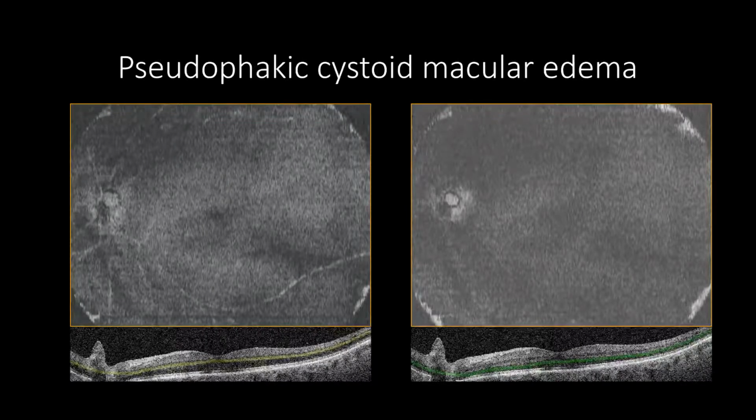Enface OCT can help to have a pan view on the cystic changes distribution in the posterior pole and help to follow up the cyst's resolution post-treatment. As shown here, those are the same slabs for the same patient post-treatment with a suprachoroidal injection of triamcinolone showing resolution of the hyporeflective cysts.